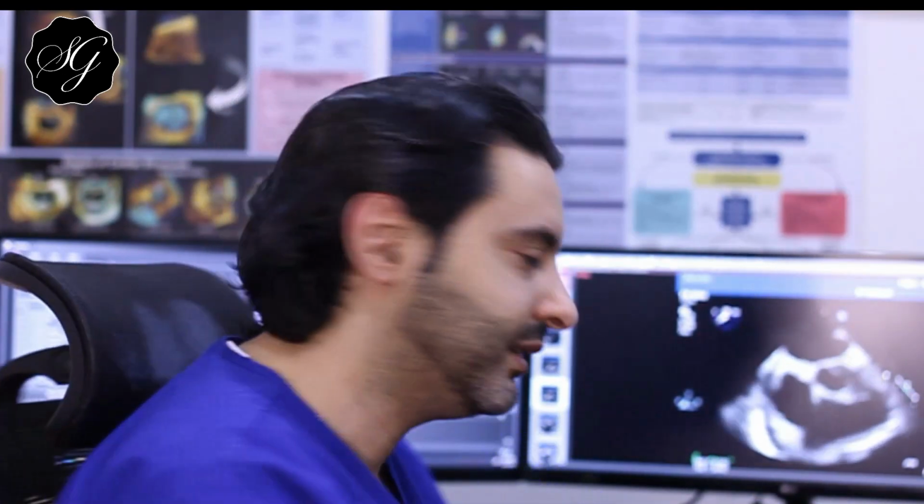Right ventricle and right atrium chamber quantification is less complex than the left side ones. However, they are as important. Join me to this short lecture about the right side chamber quantification. So let's begin.